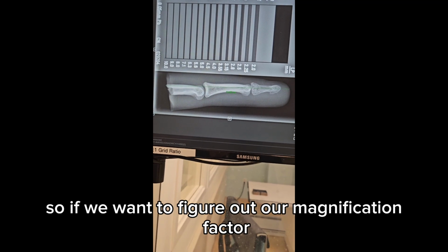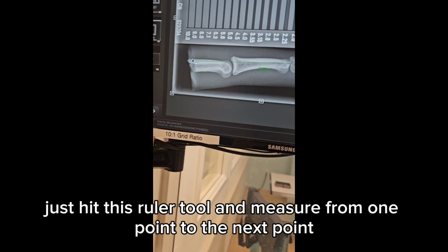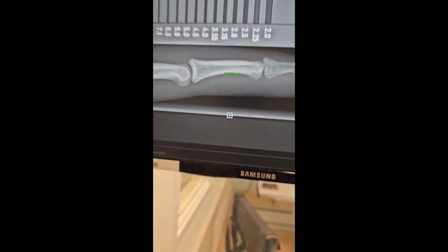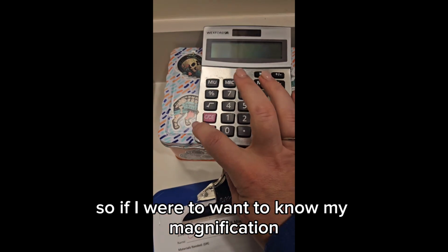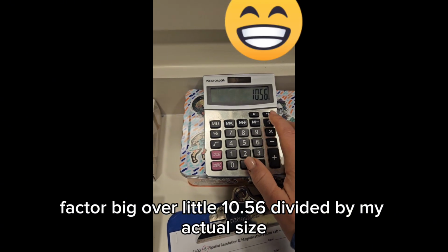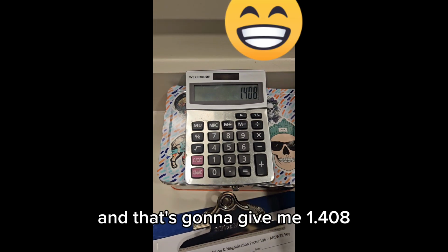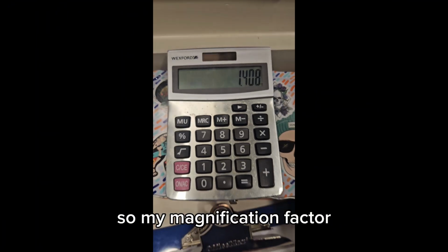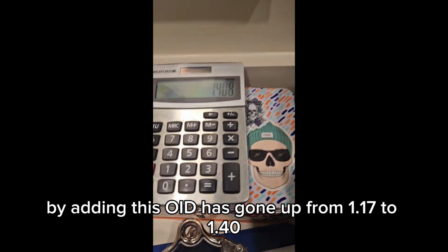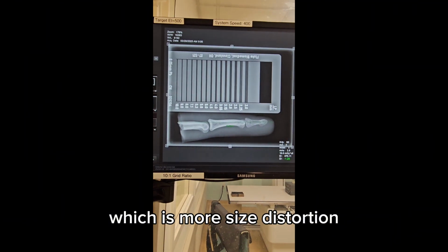The measuring. So if we want to figure out our magnification factor, we just hit this ruler tool and measure from one point to the next point. This is going to read 10.56. So if I want to know my magnification factor, big over little, 10.56 divided by my actual size, which remember was 7.5. And that's going to give me 1.408. So my magnification factor by adding this OID has gone up from 1.17 to 1.40. So we have more magnification, which is more size distortion.